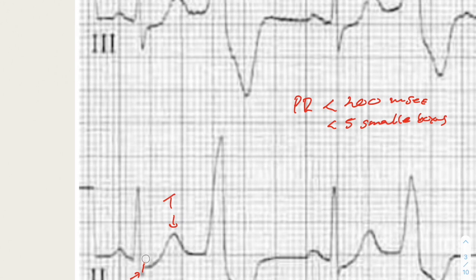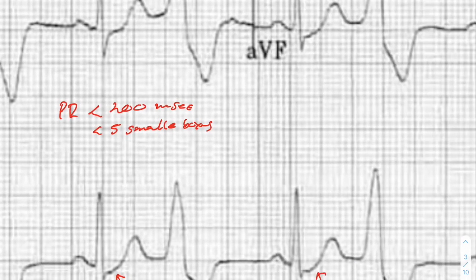But of course, we're actually not seeing that here. This is a good example of ST depression. You can see the ST segment is underneath the isoelectric line, which is floating about there. And this is an example of upsloping. You can see there's a little slope there, ST depression going into your T wave. And that is persistent in all leads, in every waveform that has a normal conductance pattern. You see it there, and then we'll just look at the third one there again.